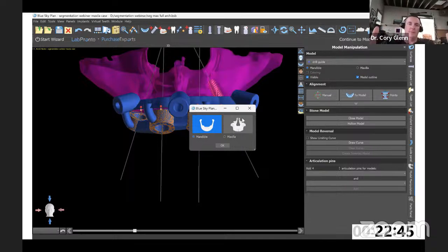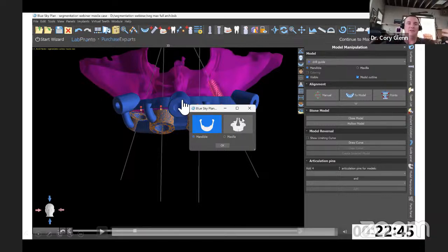And it's less volume for them to print, but from your perspective, it's just so much easier to insert with less of a flap. Same with bringing down the dimensions of your wall thickness on your tubes. If you don't know where to do that, it's under Tools, and then you go to the bottom at Preferences, and you'll see there's a setting that you can alter for guide tube wall thickness.